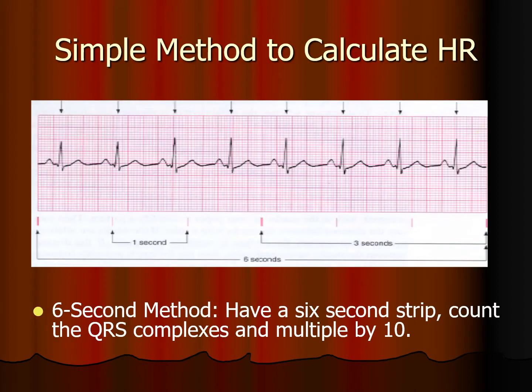All right, now, in a simple world, actually the simplest method is if you have a regular rhythm, meaning everything marches out, like boom, it's like a metronome. Like if you were going to play music to this and you were clapping, you would clap on the beat, right? There's no weird beat to this. It marches out. Okay. If you have a nice regular rhythm, look at the monitor and whatever number's on the monitor.